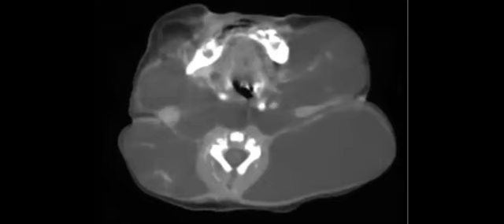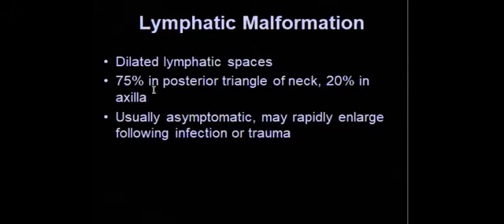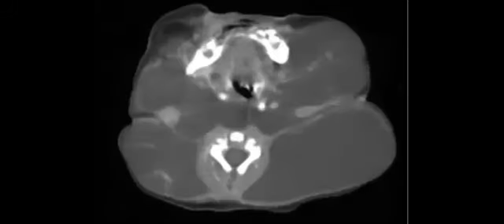Yeah, it can be a vascular or lymphatic vascular malformation. So this is the big ugly lesion. It looks like dilated lymphatic spaces. With cystic hygroma, it's like on one side, asymmetrical. Maybe sometimes it can involve everything, but when you find this big ugly lesion, it's more likely to be lymphatic.